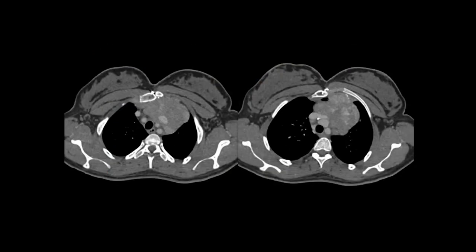When you look at the images, you see a large anterior mediastinal mass which appears to infiltrate around the vessels, particularly the left innominate vessel. There is maybe some enhancement present, but probably some calcification. What could this be? When you think about anterior mediastinal masses, teratoma, thymoma, thyroid, lymphoma, we think about. So teratoma, which in fact is the answer in this case, is definitely a possibility.